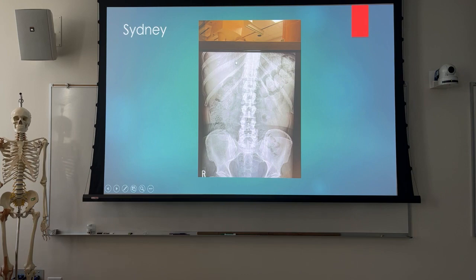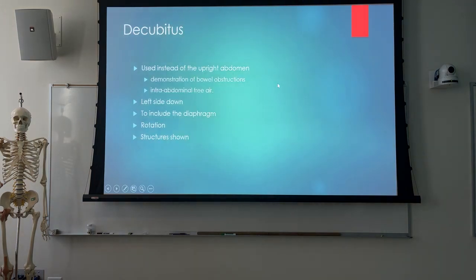But again, we look and see the lung markings down here, the posterior portion. So decubitus, just a couple of things about decubitus, and we'll be done. Managed to get through that in about an hour, maybe a little bit more.